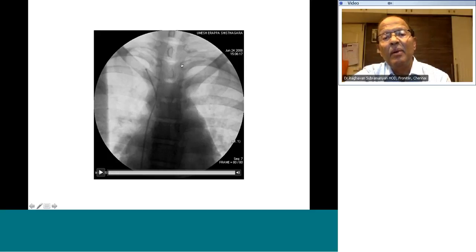The vertebral bodies have two pedicles, one on either side. Those two pedicles are pillar-like structures that go from the vertebra backwards to fuse with the spine. The canal is in between. Now the two pedicles are seen end on.